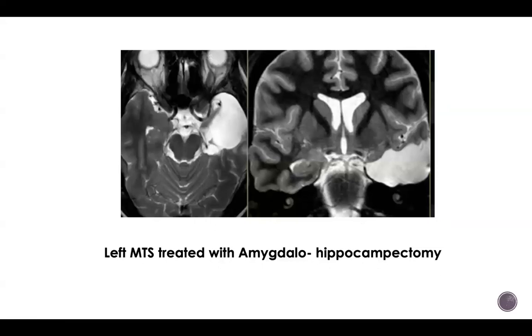So MTS is treatable surgically nowadays by a procedure known as amygdalohippocampectomy. As you can see here, this is a post-operative MRI image of the condition in which there is removal of the amygdala and the hippocampus, which is represented by a CSF-filled cavity, a post-operative change.